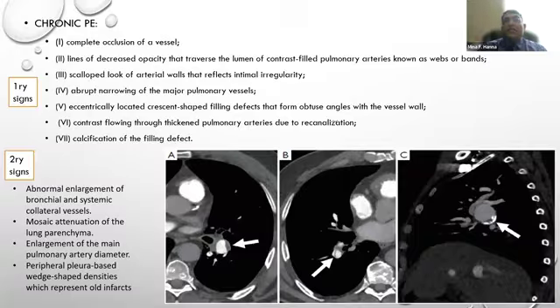You will find the infection distribution is more in the parenchyma, more lower lobar, more patchy, not wedge shape, and not restricted to the peripheral. Okay, so infection is all over the place, and it could be on the other side as well, not only restricted to the area of pulmonary embolism. So you can differentiate them.